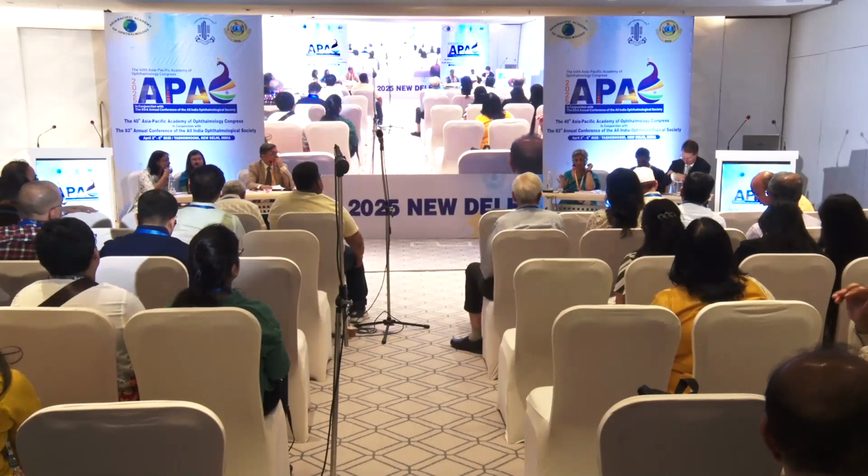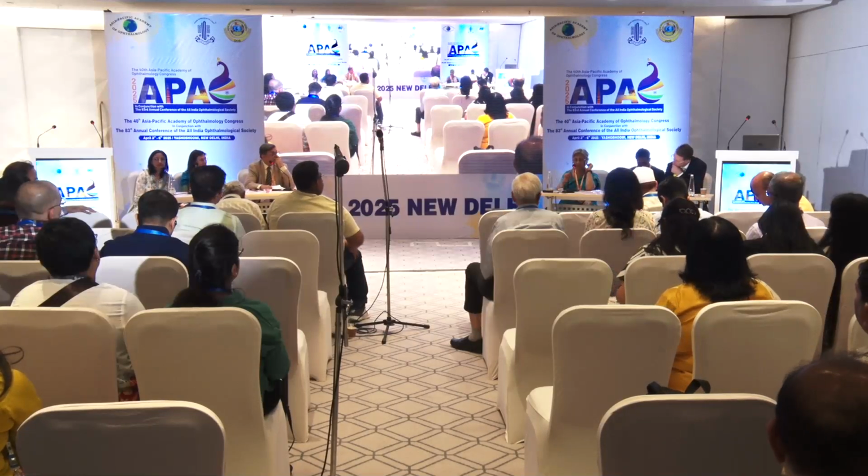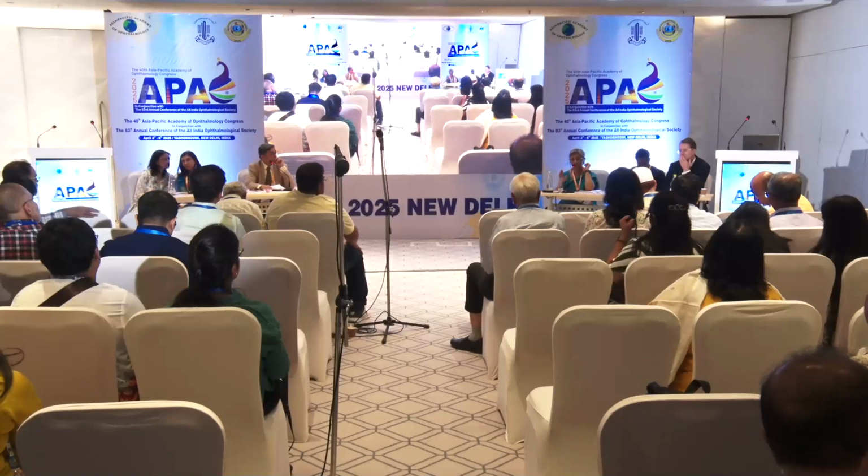it is definitely normal. Very important to see is whether that particular profile is going down and entering into the yellow or the red area, which shows us that in that particular area, the retinal nerve fiber layer has become very badly thinned out. Now, similarly, it is seen in the left eye.